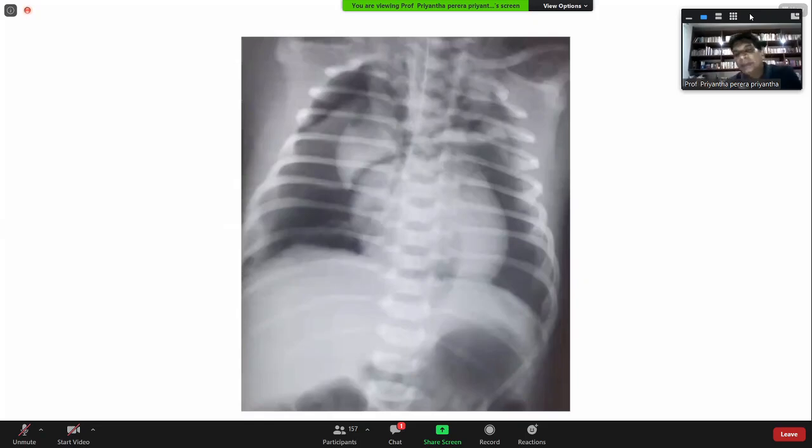And once you enter the pericardial cavity, you will find air coming out into the syringe, right? So you have to carefully drain it, avoiding pricking the heart. If you prick the heart, you can induce ventricular fibrillation, right? So these are pneumopericardium. The main clue is the thymus being stripped off from the heart, right?